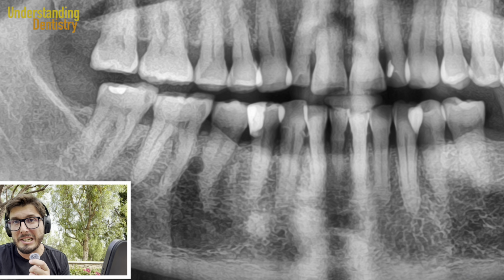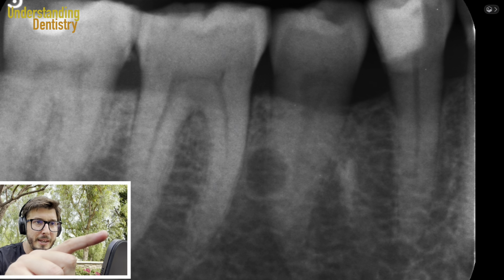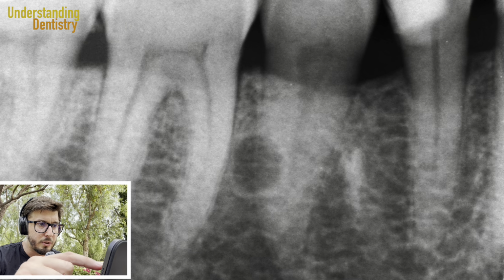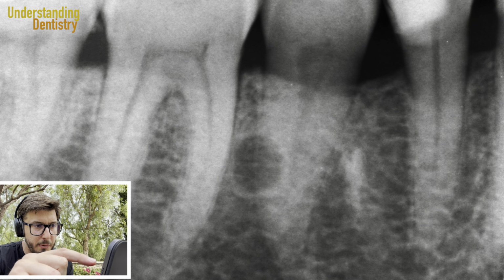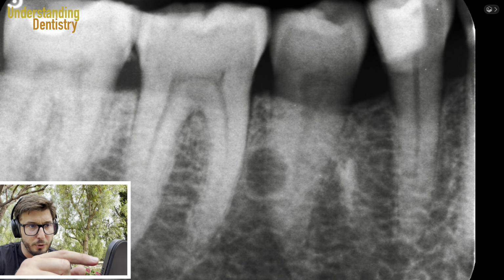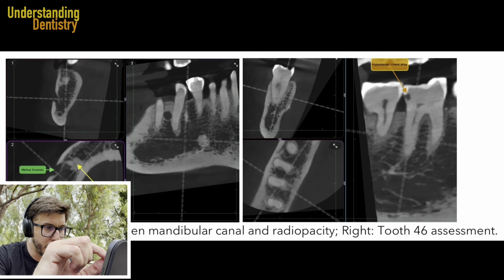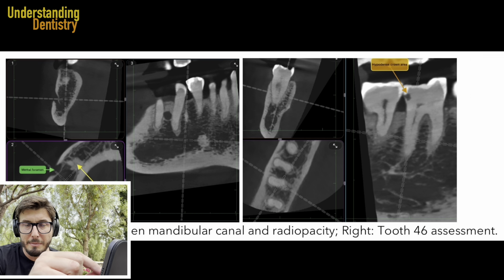But then to plan the surgery of this lesion, even a CBCT is better because you need to understand if this lesion is on the buccal side or the lingual side. So let's see, that's the OPG of course, and that's the PA, that it's a little bit better. So the lesion is closer to the second premolar as opposed to the first molar, superimposed to the lamina dura of the second premolar. All right, so to plan the surgical removal of this lesion, then you need a CBCT. We took a CBCT and let's see now the findings of the CBCT.